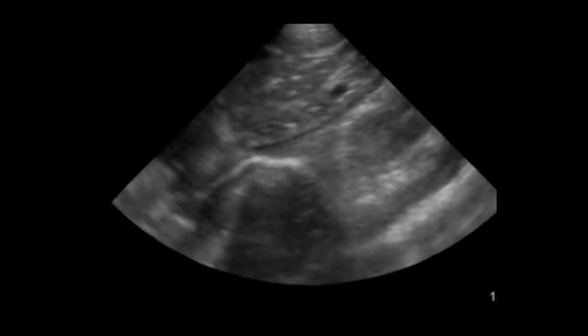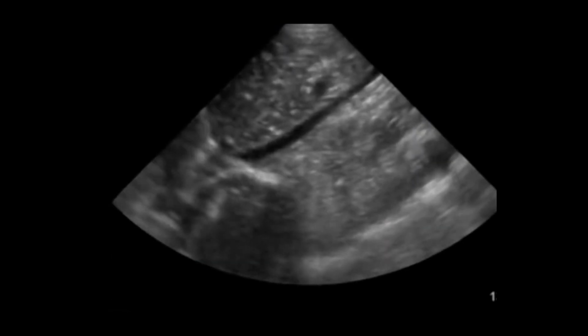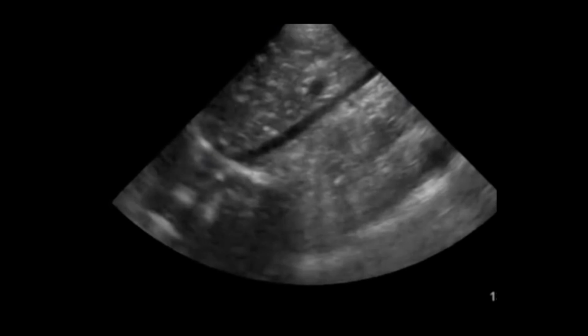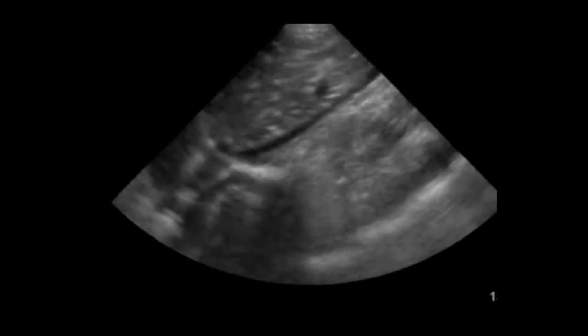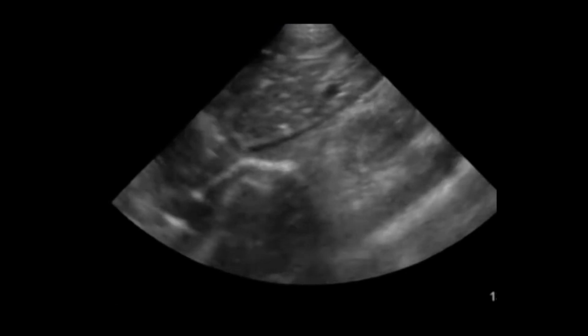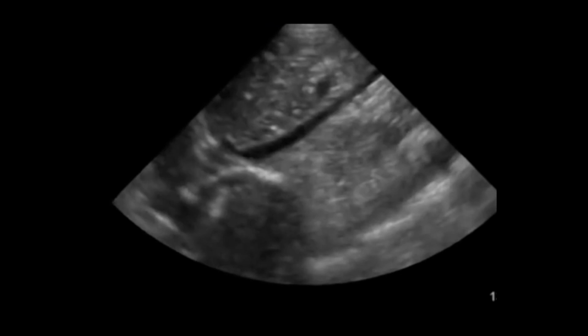Based on a couple of studies by Adler et al. and Kircher et al., an IVC diameter of 1.5 centimeters or smaller with complete inspiratory collapse, that is, on inspiration the walls of the IVC collapse together, is associated with a good response to volume boluses and consequently a low CVP.